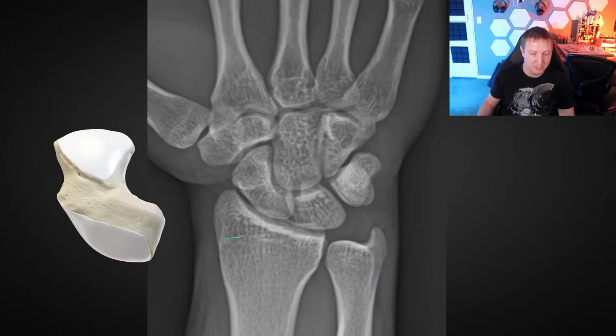Often we will see the physeal scar where we used to have a growth plate for the distal radius, and then sometimes there'll even be a little overhang of the edge there where that united, kind of leaving a bit of a spur almost, and that can be a normal feature. In this case, it transitions nicely in that region.